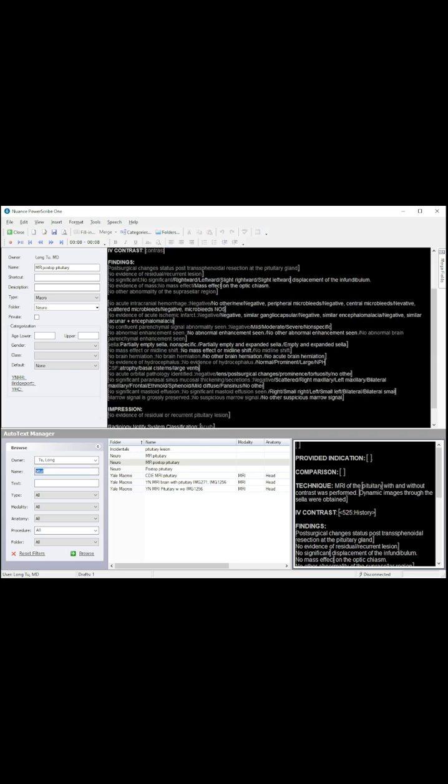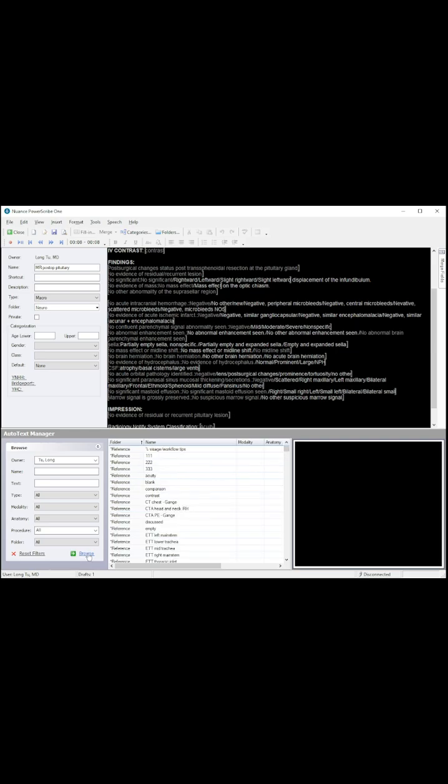I should say, by the way, since we're covering basics here, if you're just getting into this process, learning about some of these mechanics, trying to improve your efficiency and minimize the free dictation that you're doing, one of the most high-yield things you can do is go to your institution. If you were a trainee where I am, I would encourage you to go through and steal other people's macros. Of course, we have system macros that are built into the system.